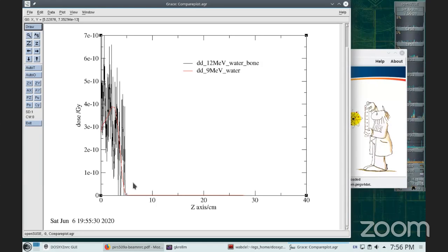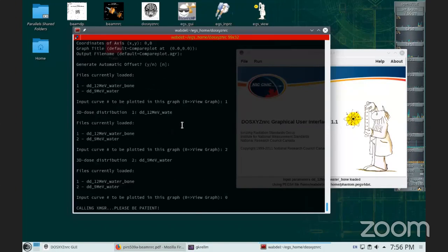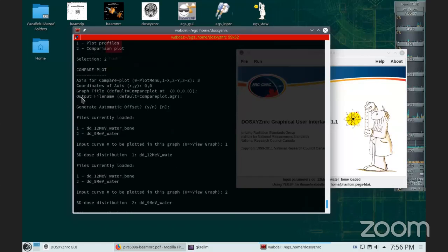That I think I ran for 300,000 or something like that. I forgot the number. And I use parallel processing. Okay. If you want a profile, then by the way, for Windows, this is not going to work. It's going to generate the file. The file will be saved with this name. Let me show you. So the output file, probably there is a file now in the directory.